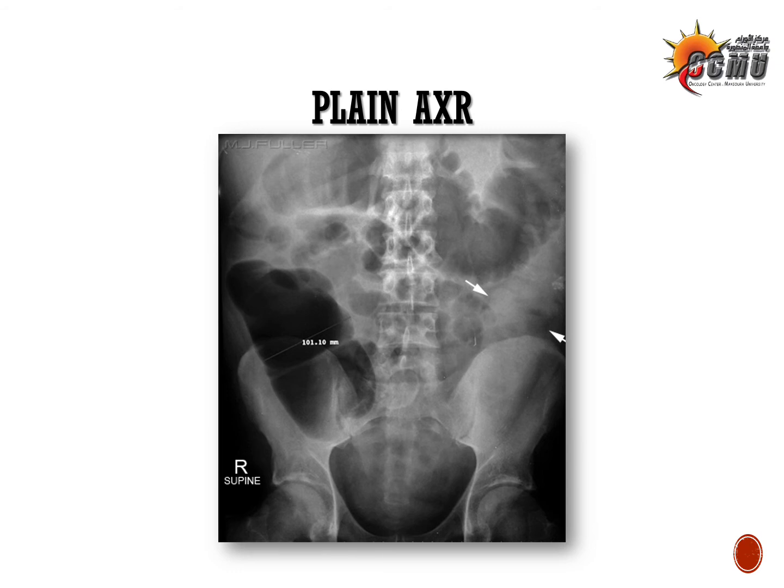So you should also know that when the cecal diameter is beyond 10 centimeters, the probability of cecal perforation is high. And of course, the cecum always dilates to the largest extent, no matter where the large bowel obstruction is sited, and that's according to Laplace's law that you may have had an idea about in physics in secondary school and so on.